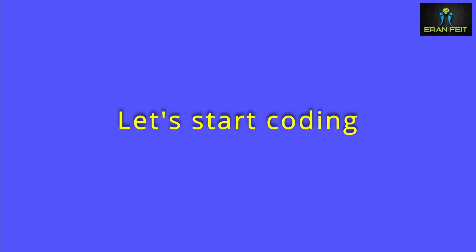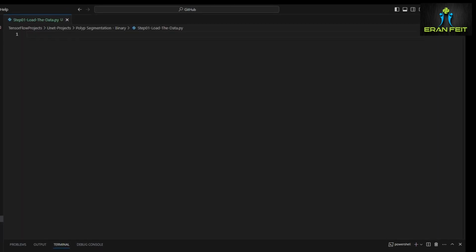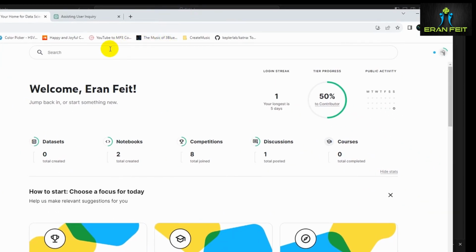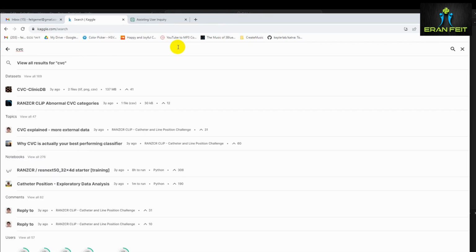Okay, now we are ready to start coding, and the first Python program will deal with preparing the data. So let's create our first program. We will name it step number 1, load the data. For that we will go to the Kaggle website and look for our dataset. It's called CVC Clinic DB.